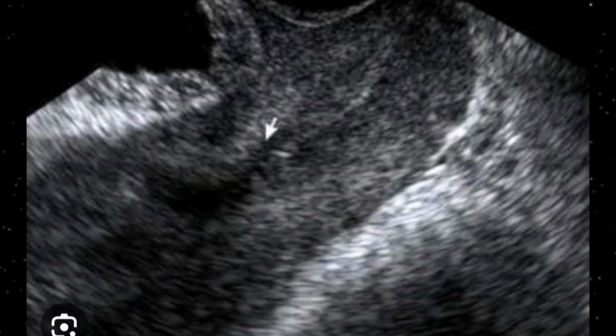In this slide, the image of the cervical canal and cervical length seems to be okay, because the cervical length is quite sufficient and the cervical width is also okay, but the only one point visible here is the dilated internal os. This internal os is more than 4 millimeter, and on top of it you can appreciate a small part of membrane trying to bulge towards it. It means it has started gravitating towards the internal os.